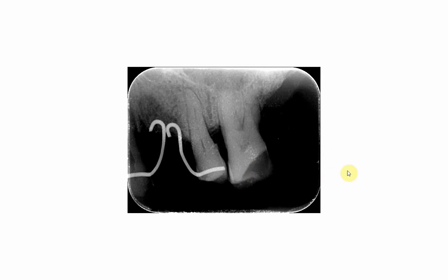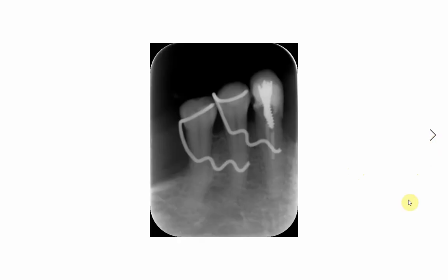If this radiograph was of a lower density, you could even see the teeth in this area. Again, this is a contraindication, because you want to see a clear area that is not covered by any foreign object. Same problem repeated over here. See the clasps, they are left with the acrylic removable partial denture, and the operator has failed to remove them.